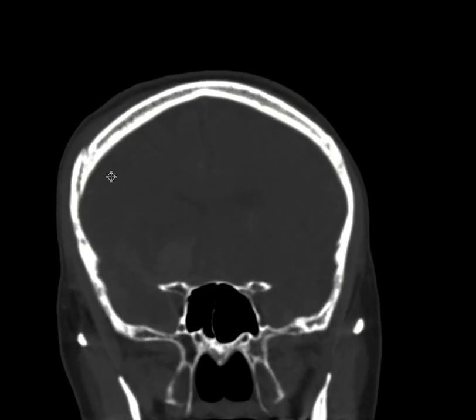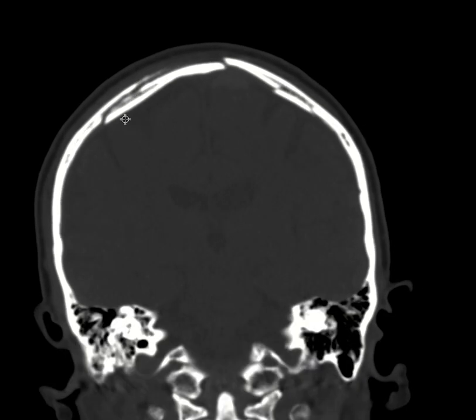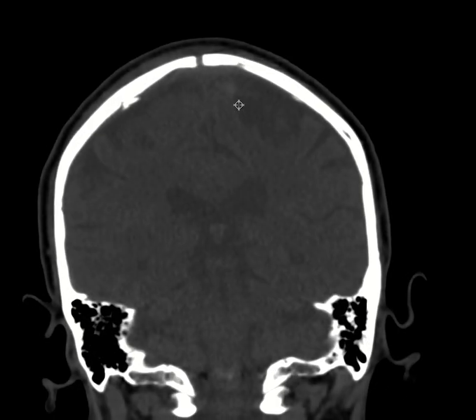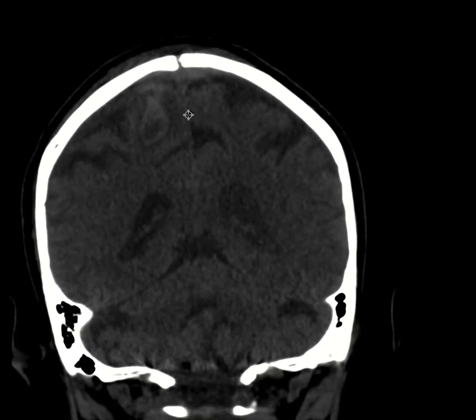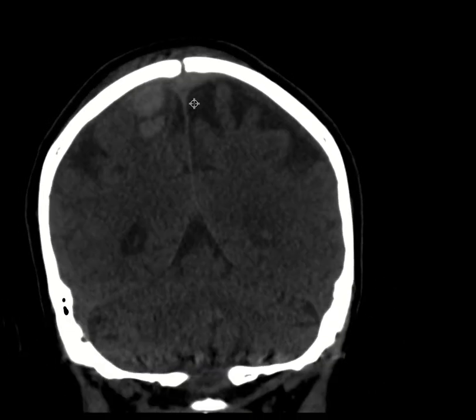Okay, so this is very obvious now. You see that all these are displaced fractures. We need to tell the surgeon how much displacement they have. And that's why they have these subdurals beneath these fracture lines. The other important thing that we have to mention as radiologists is that you see these fracture lines and this hemorrhage are just abutting the superior sagittal sinus.